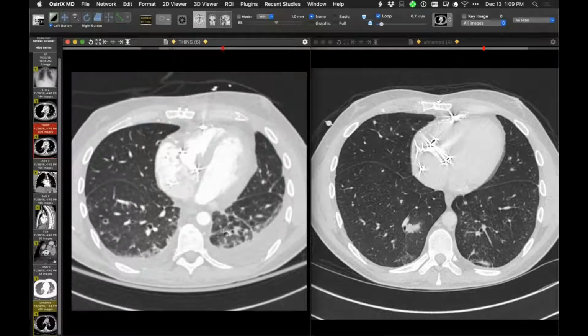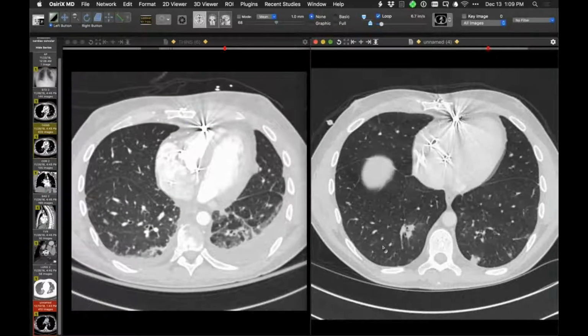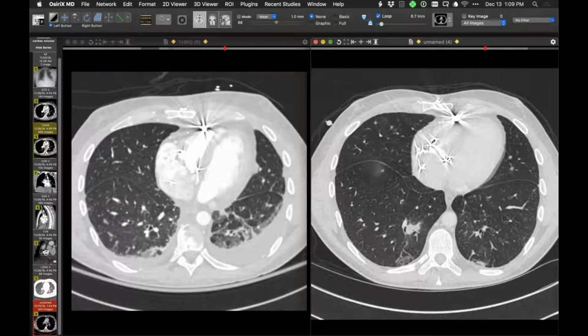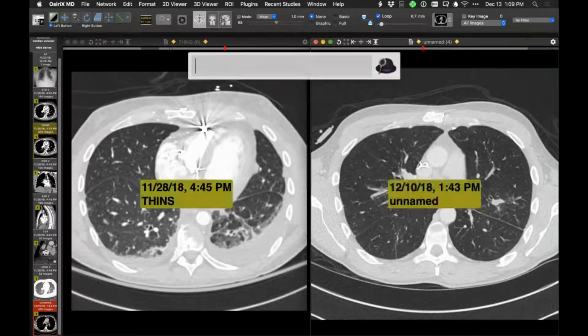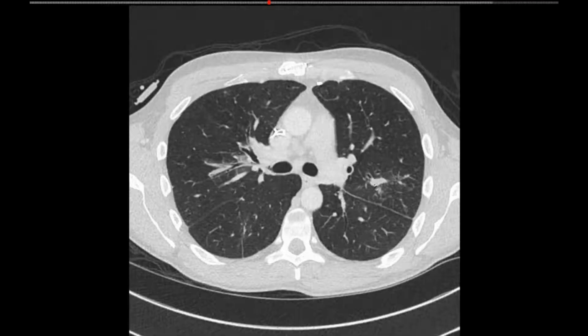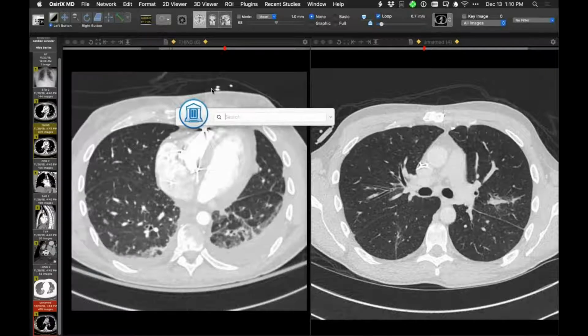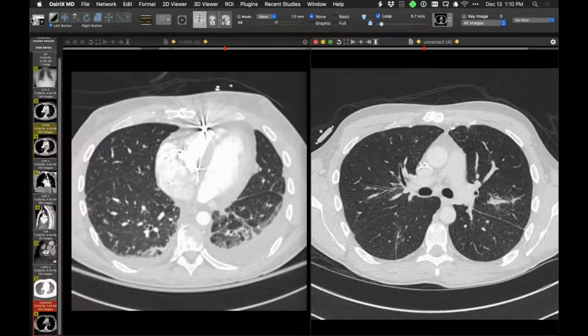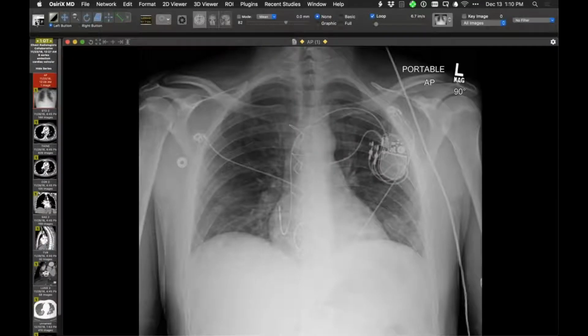That's pretty cool. So that's the way I read it out, and I may never know, but I noticed there was definitely a change in a couple places. There was another one up here where this vessel here had also increased in size with a little bit of opacity around it in the lung. This one too. Sorry about that. So that's really interesting. So let me show you a couple others.